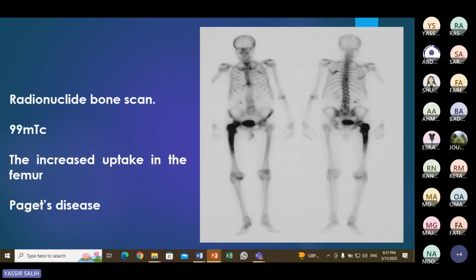Like to explain this, when we say imaging examination, we mean the modality and the examined part. For example, this one, radionuclide bone scan. The modality is done for which part? For the bone. So this is radionuclide bone scan. Imaging modality is the technology only. The imaging examination includes the modality and the examined part. For example, X-ray for the chest, X-ray chest. This is the examination. But the modality is the plain X-ray or conventional X-ray without the examined part. So this is radionuclide bone scan.